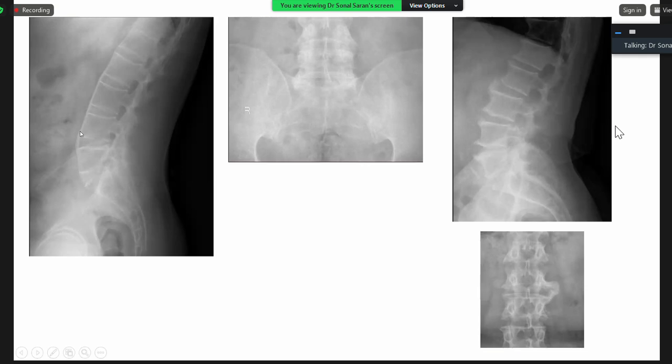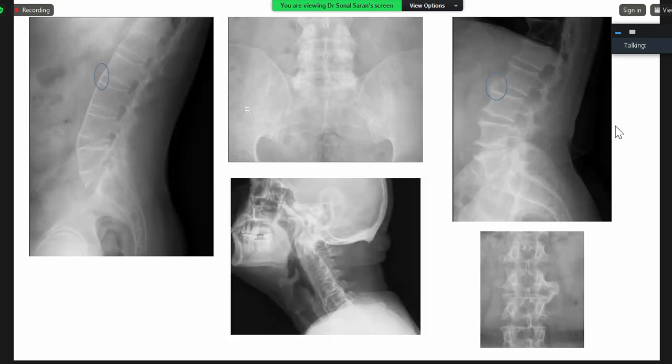So you can see the clear difference between a syndesmophyte and an osteophyte. Osteophytes are basically thick and chunky, whereas syndesmophytes are very fine, linear, and thin. So this is osteophyte and that is syndesmophyte. And this is a radiograph of flowing ossification along the anterior aspect of vertebral bodies in a case of DISH, that is diffuse idiopathic skeletal hyperostosis.